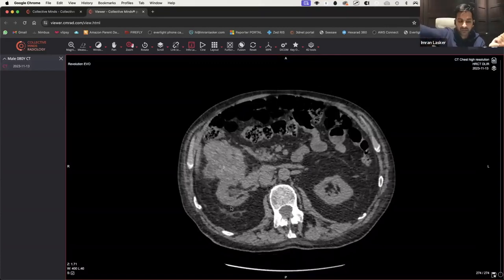So this person could go home with antibiotics or get what they actually need, which is probably going to be a full staging scan, potentially biopsy, or excision and referral to urology and all that kind of thing.